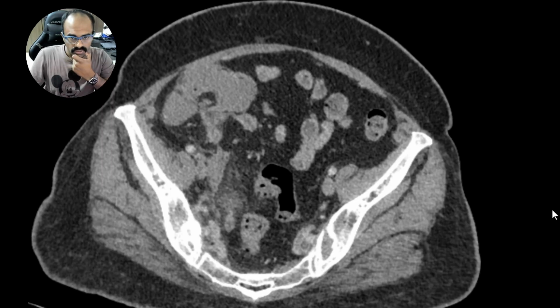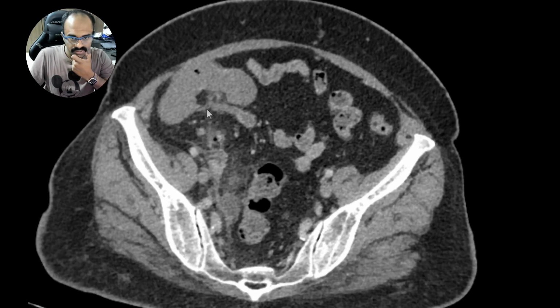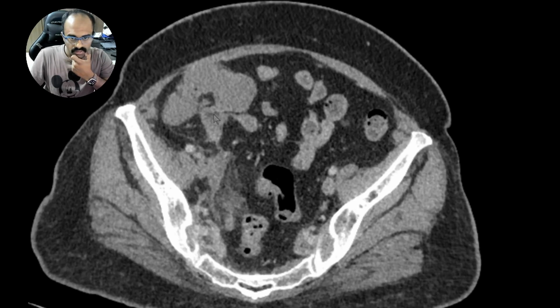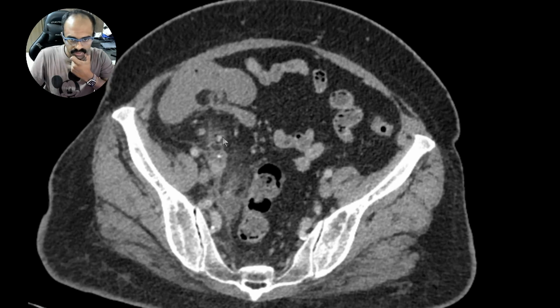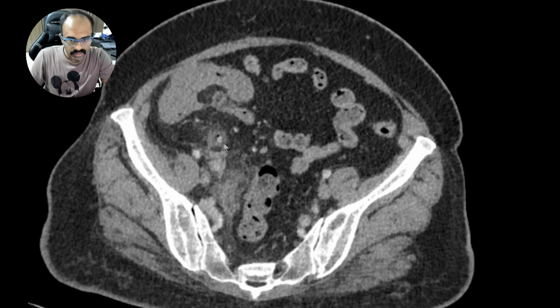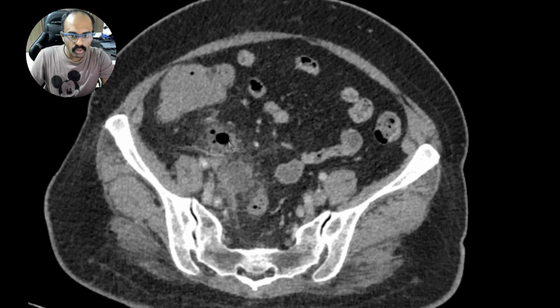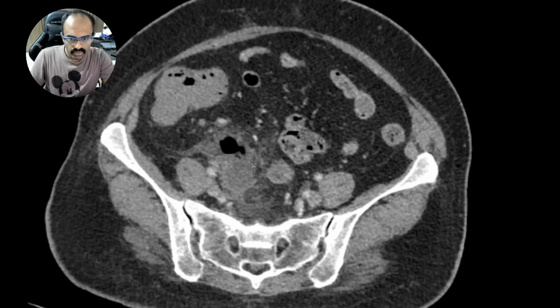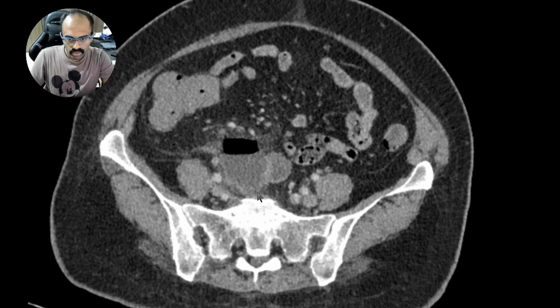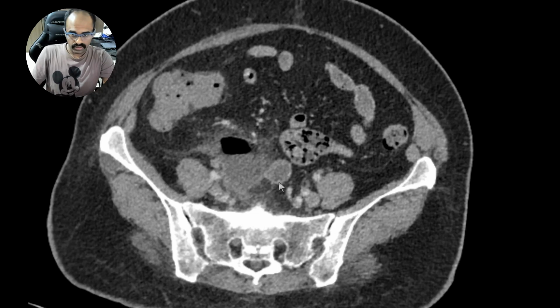All right. So let's see what's happening here. Now see here, okay. So this is the appendix, okay. So ileocecal junction, appendix, ballooned, dilated. Let's trace the appendix. What's happening? There appears to be some hyperdense content within, possible fecolith, appendicolith, and this appendix all of a sudden is having thinned out walls which are interrupted in enhancement. There is a large air focus identified here which is ballooned up into a fluid collection which is showing an air fluid level. Some adjacent bowel loops are also inflamed in and around it, okay.